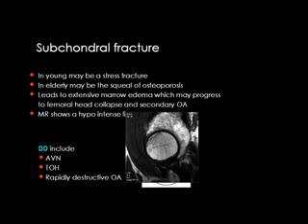And if this fracture happens, you will get a line and you will get bone marrow edema. Then you may be confused with avascular necrosis.